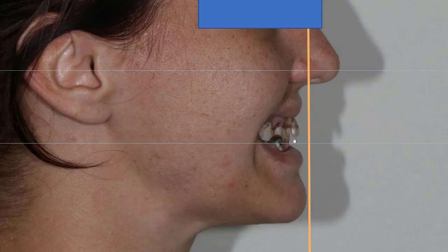I'm also going to look here at the wet-dry line of the lip. So that's about right here, and that incisal edge should be touching right on that. If you think about saying 55 or any of your fricative sounds, the incisal edge should touch right there on the wet-dry line of the lip. So if anything, hers could maybe come back just a bit, but no major changes there.